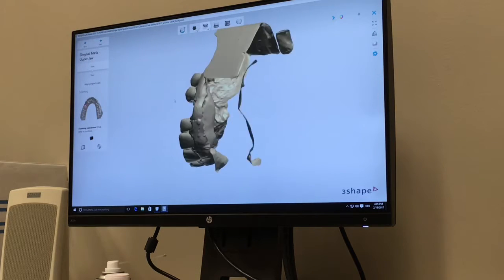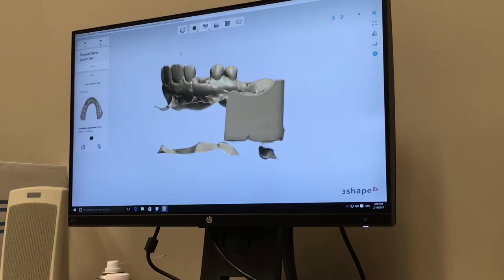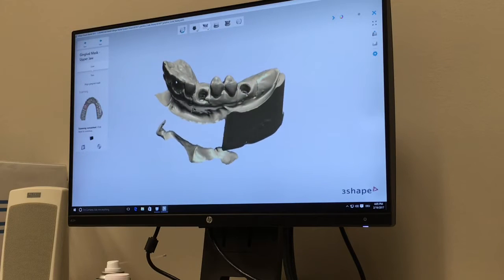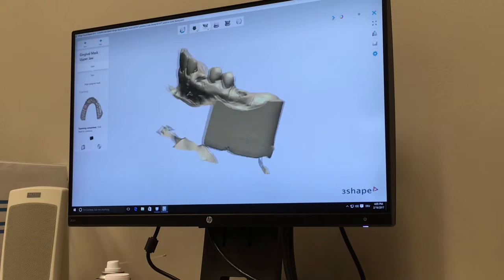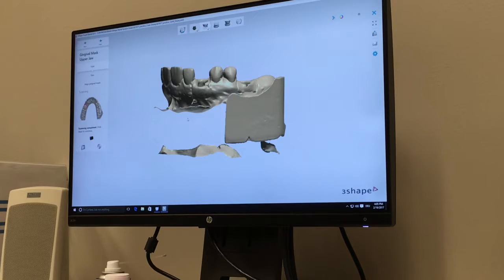Okay. All good to go. I'm just holding down that right button on that mouse to do this. You just hold on to that right button and start moving your mouse around. You can do with it what you want. Remember the other two features. Okay. We're going to keep going.